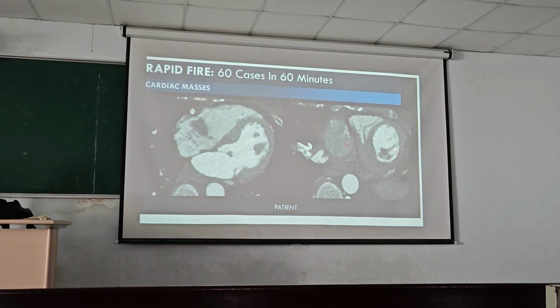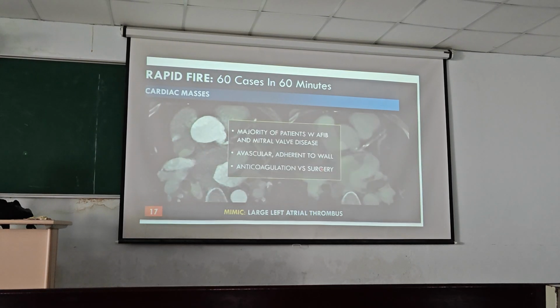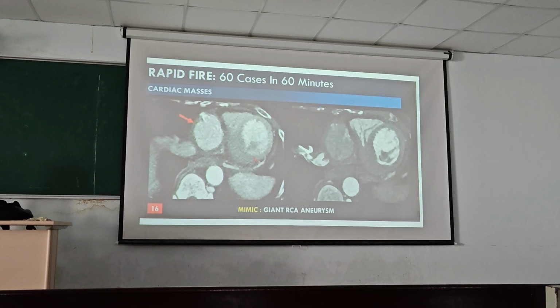So this is actually an aneurysm. So you get the delay. So on the contrast, it's an aneurysm of the right coronary artery. So be careful with biopsy.